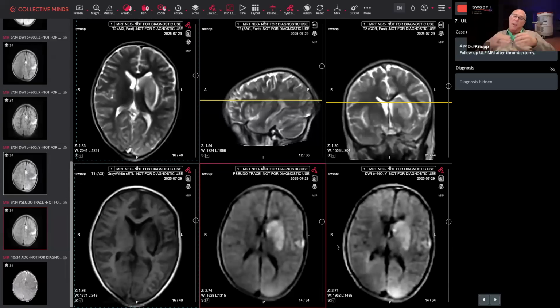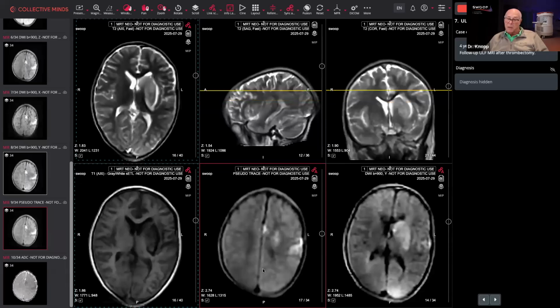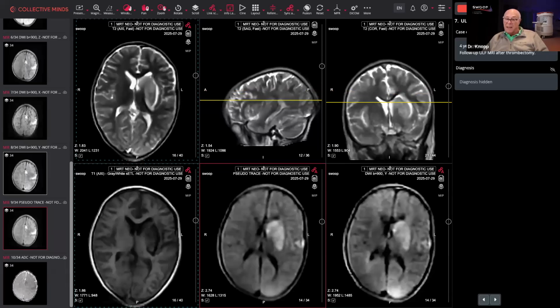Could you probably comment on that as well? Sure. So what we note, and it becomes important in positioning, especially children, in the Hyperfine scanner, is that proximity to the head coil itself can cause increased signal abnormality. Here it appears to be more manifest on the unidirectional diffusion than on the multidirectional diffusion. I think this has to do with the head resting on the coil surface and not on a pad to separate it out. So in my mind, that's artifactual and not pathologic.